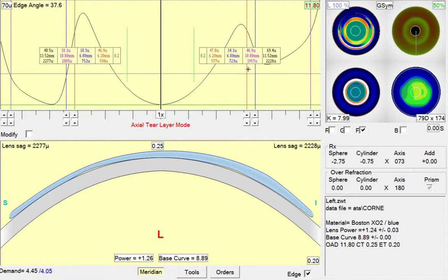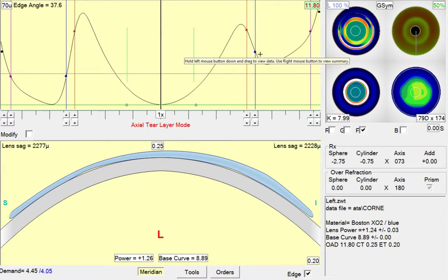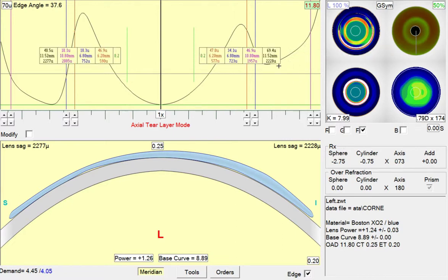Okay, so now we're at 723. So you notice when we adjusted the IC or blue control point, it also changed the vertical position of the pink or the edge control point, and we want to bring that back. So right now at 1957, we started at 1986, so we want to bring that back down to 1986.